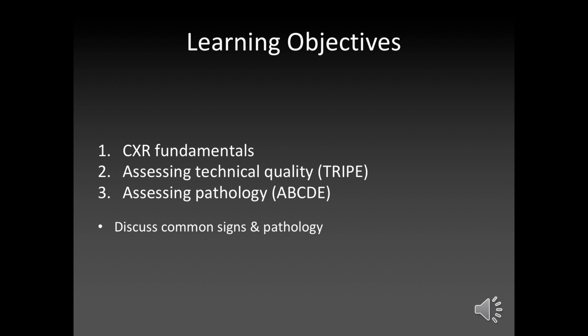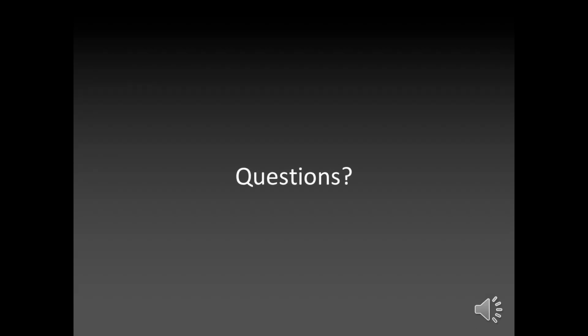And we've gone over some of the common things that you'll see. There's not much else that you'll see beyond pleural effusions, consolidation, and tumours. Okay, any questions?